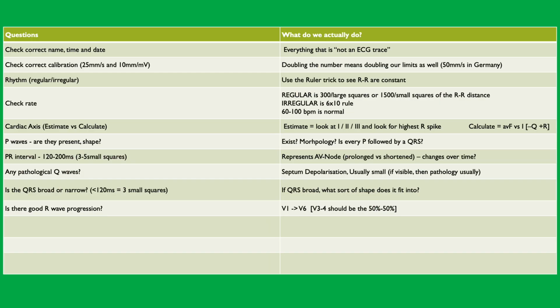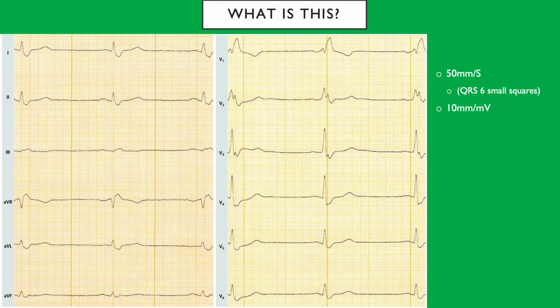Good. Then, so what is this one? This is the double rate. So QRS should be 6 small squares. Bradycardia, so I can say. Okay. Right, due to the V2. ST depression or inverted T wave. You said right. Okay, keep that thought. Okay, we're gonna do it later. Okay, let's go to the theory first.